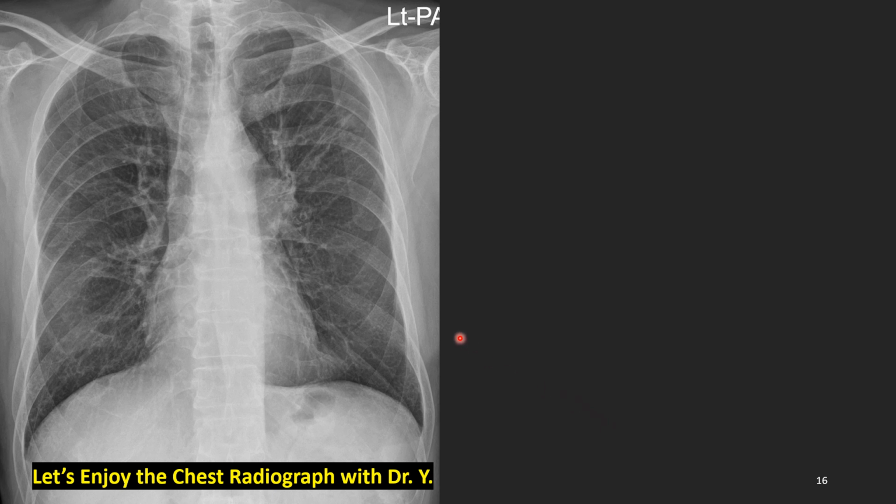Now let's begin the small cell lung cancer. Yes, we know this patient image. Yes, we have seen him before in the previous session. This is small cell lung cancer with lymphatic obstruction. Increased density, deformed normal anatomy, deformed mediastinal line, increased opacity, all are telling us this is the tumor, a large tumor.